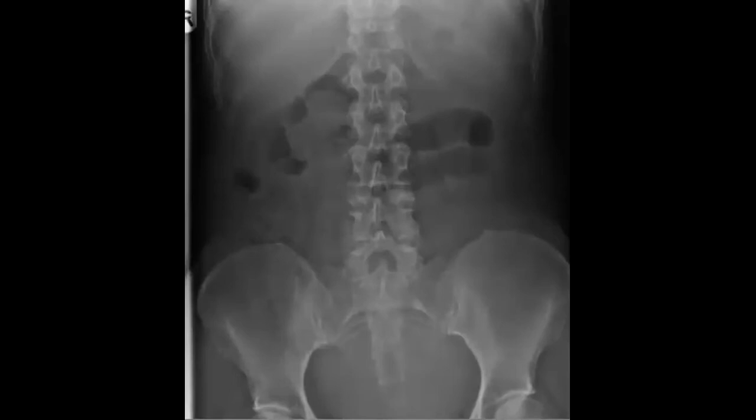Okay, Nermeen, yes, there are some dilated bowel loops in the middle of the abdomen, and it's good to mention that there is no free gas in the abdomen, no free intraperitoneal gas, so no pneumoperitoneum. So with dilatation, and it's better to mention that it is small bowel, like Nermeen, the best nice answer.